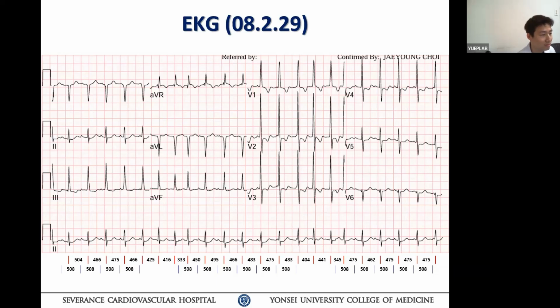It means it could be the JT. Okay. So if it is JET, as Washi mentioned, usually JET shows a regular tachycardia. But it is a little bit irregular. It shows the irregularity, so somebody should discuss that.